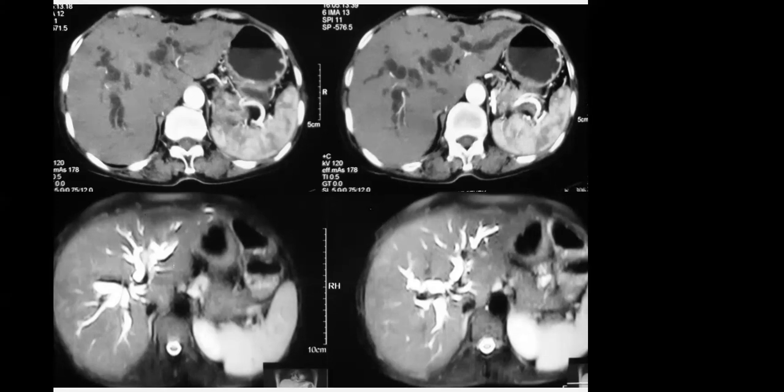Now coming to the basic sequences in MRI, when you see an MRI film of a patient, you will see a lot of images of different combinations of shades of gray. Here, the lower two images are the T2 weighted images, where the fluid containing structures would appear bright. So the fluid inside the bile ducts, the fluid inside the spinal canal appears bright or white. Here on MRI, when something appears bright, we call it hyperintense.